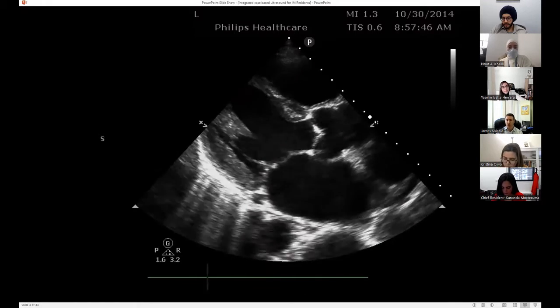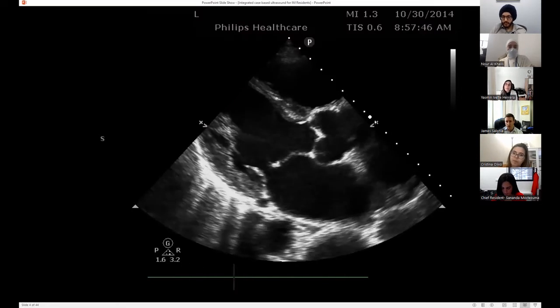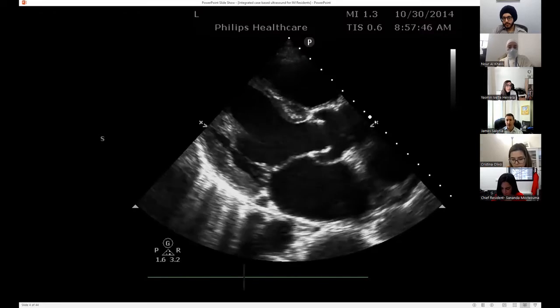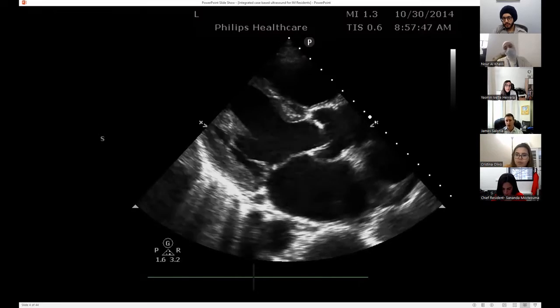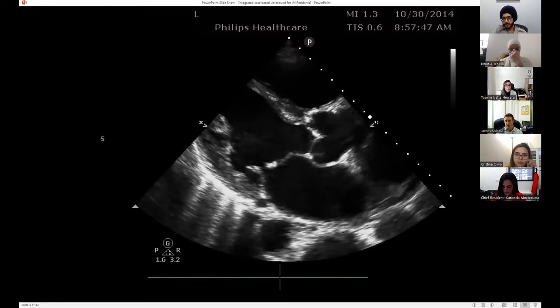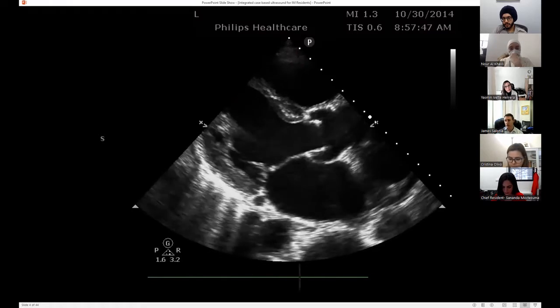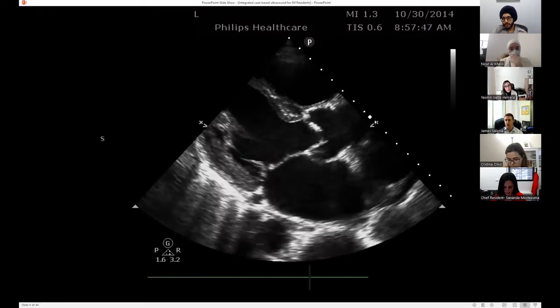You'd also want to look at something we call pulse wave Doppler, right? So you'd look at the flow across it, and then you'd actually measure and calculate a gradient. And then by a continuity equation, you can actually calculate the surface area. And then you would be able to determine if somebody has mitral stenosis. So much more complex, beyond the scope of this lecture, but I like the way that you're thinking, because if you have mitral stenosis, that will affect the valves independent of left ventricular function, right?